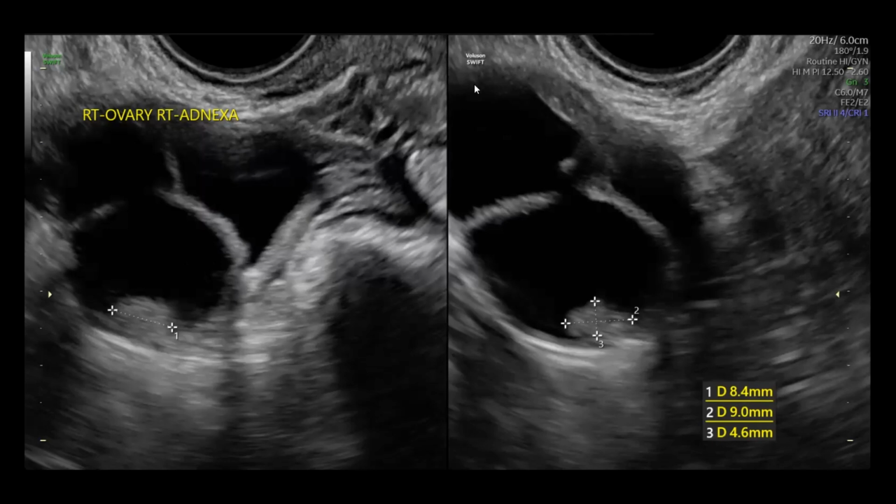In this case, we have an adenomyotic uterus, very obviously adenomyotic based on MUSA criteria. We have what I would describe as a normal left ovary with several follicles present and some peripheral hyperechoic features, but those are ill-defined at this time in terms of an etiology. On the right side, we have a multiloculated cystic lesion with at least 4 locules, probably 4 is the right number, and we have overall 2 papillary projections and an additional solid component.